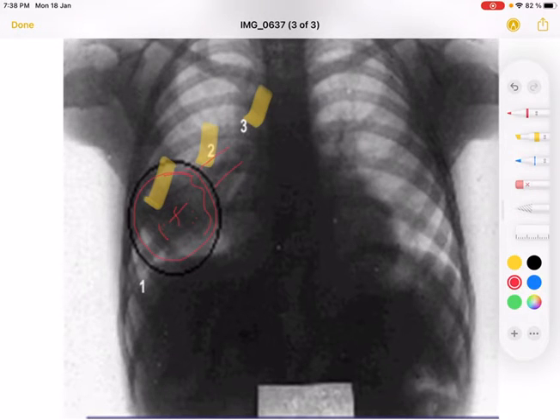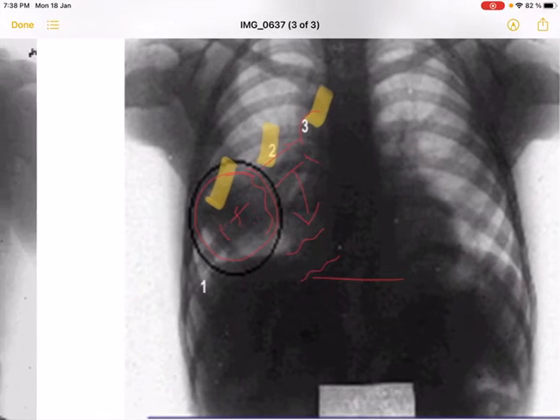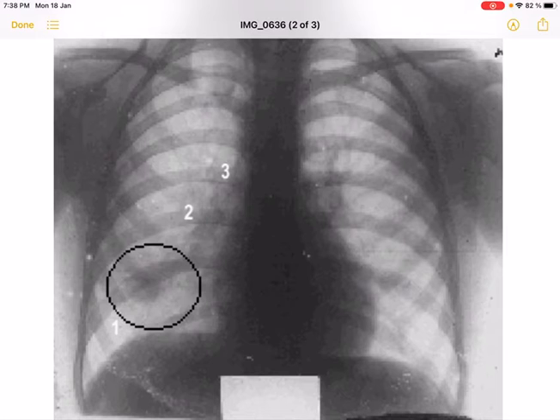And the lymphangitis is also not so prominent. There is an unclear contour of the lymph vessels, and the lymph node involvement is at an initial stage. The contour is not clear and the intensity is also weak. If you compare this image with that of the next stage, that is the resorption phase.